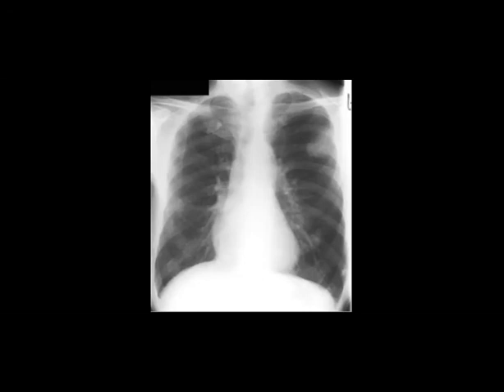And look also again for sutures, as this patient could have renal cell carcinoma. So a rib lesion with sutures in the neck region can be metastasis or hyperparathyroidism, or if you go down and look for anything that gives you a clue that this patient has renal cell carcinoma, again it can be metastasis. Okay.